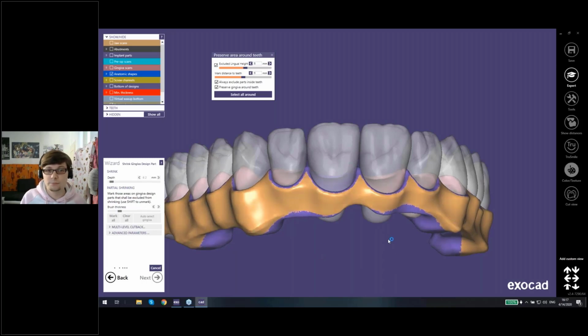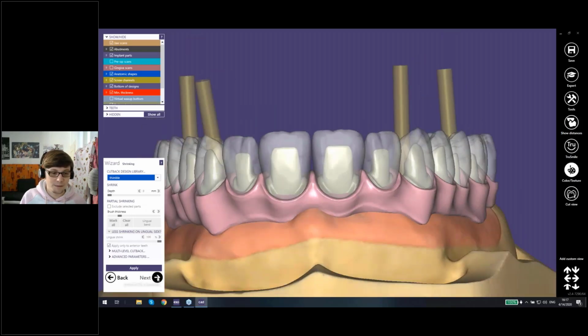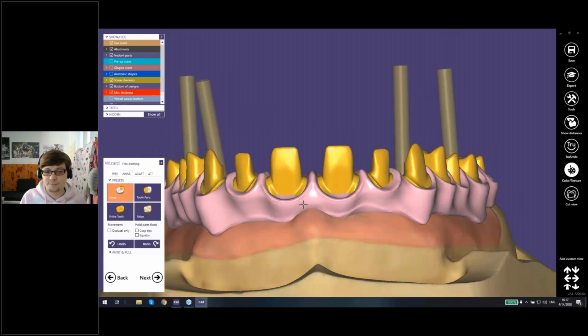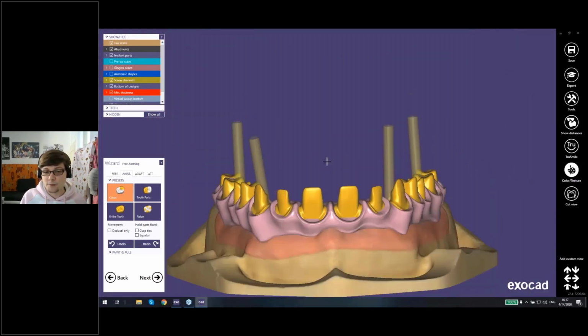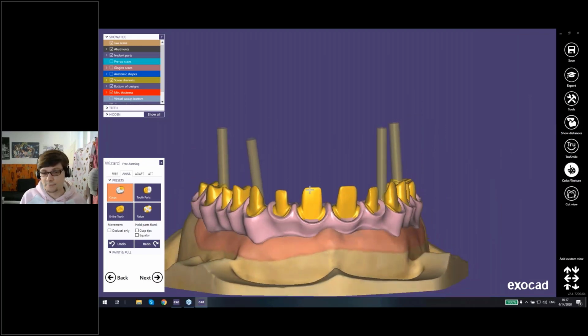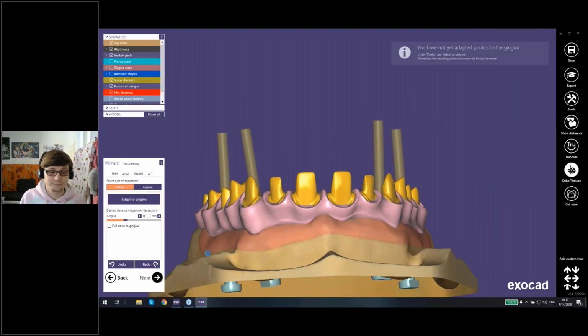with 0.2 millimeters. Up here you get a window where you have all those options where you can select that it only should mark around the teeth or the base or the palate side. So then I'm going next, and now we're at the thimble shrink. Makes sense. And here I'm going next again. And again, as I told you, you can now freeform the thimbles and move them, but it doesn't make that much sense in my eyes. So I'm again just going next.